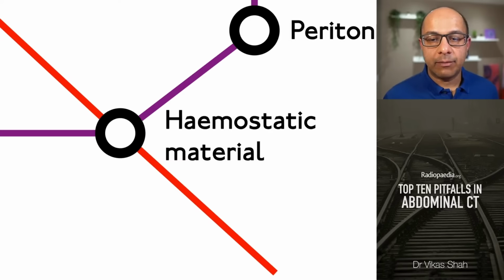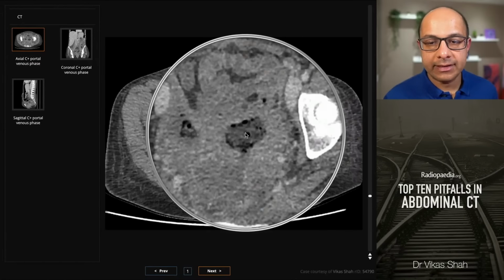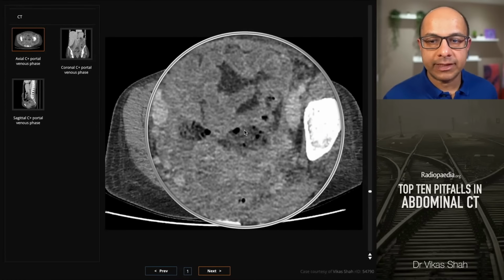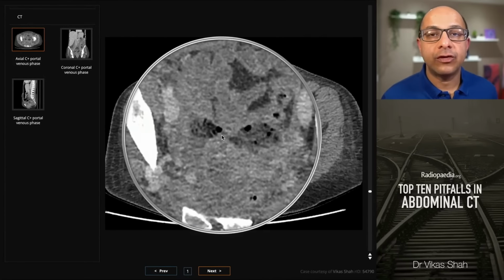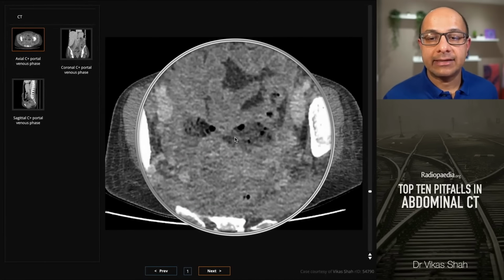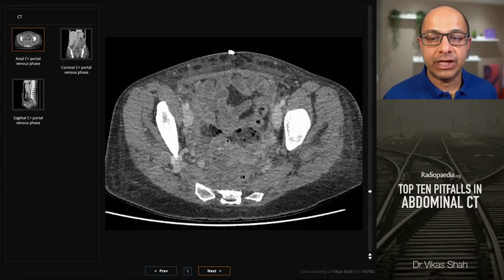So look at this example of someone who had a difficult hysterectomy, and on an early post-operative CT, because of raised inflammatory markers, there is this area lying across the pelvis, which is fairly well defined, doesn't really have an enhancing margin, but it's got lots of gas bubbles centrally amidst this low density. And this was reported as extruded fecal matter due to a bowel injury at surgery. But in fact, one phone call to the surgeon indicated that they'd applied surgical hemostatic material to the vaginal apex because there was a lot of intra-abdominal bleeding. And in fact, this is the surgical hemostatic material.